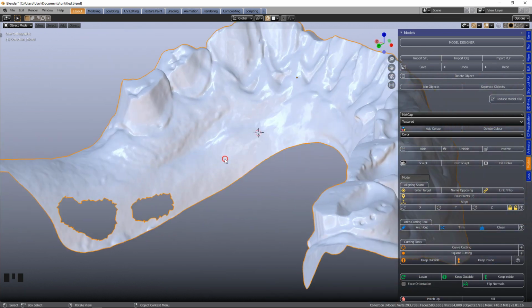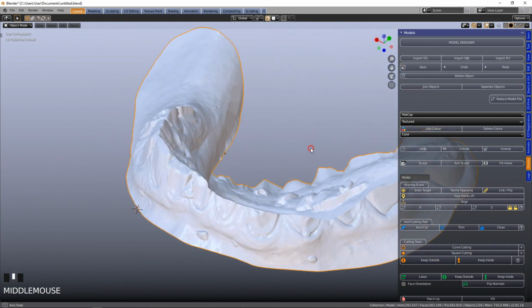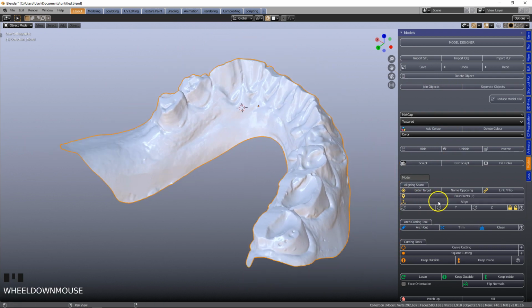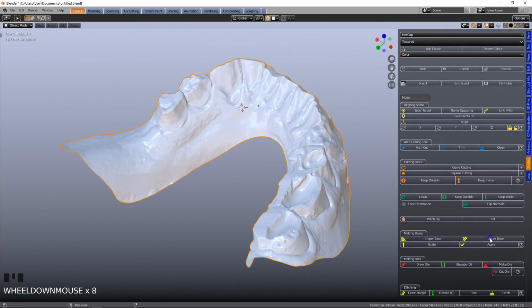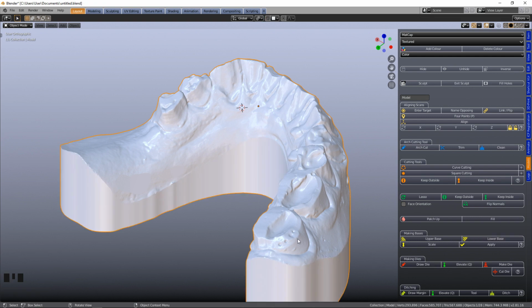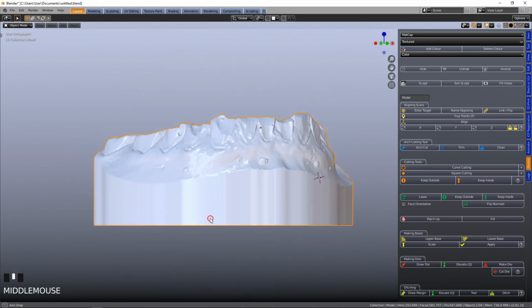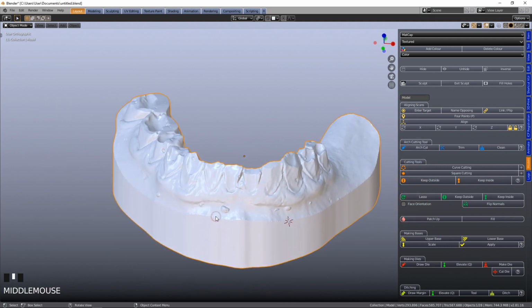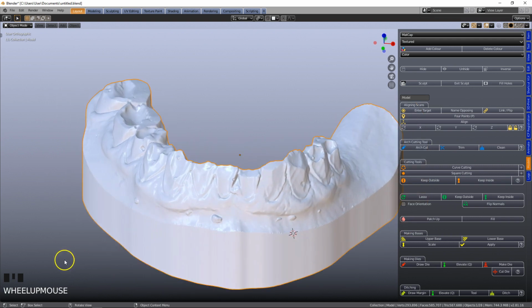So we've got 3 holes. Click on fill holes. Now your holes have been filled. If I extrude this now, lower base, we should get a nice lower model. Yeah, that's all good. And now I'm going to do this for the top, fast forward, and then continue.